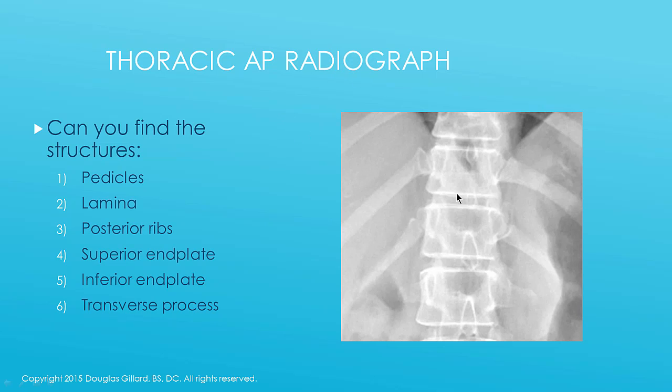And now here's a radiographic image. You can definitely see the ribs. Now, what are these, posterior ribs or what are these? What rib is this? Well, that's your T12 rib. Remember, your T11 and T12 ribs are kind of floating ribs. They don't wrap all the way around and articulate with the costal cartilage like rib 10 does. They just float in the back. So these are all posterior portions of the rib. So posterior part of rib 12, rib 11 posterior part.